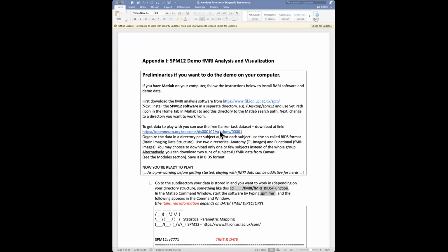There is a nice website that explains how that test is being done, and that you can download multiple data sets from different patients. We are just doing this as an example, so we are not going to look at different patients and compare statistics and what have you. We're just going to do the basics from the SPM12 with a demonstration of how you can interact with that package. So let me stop share and share my Matlab screen now.